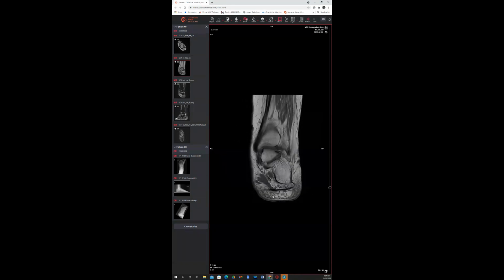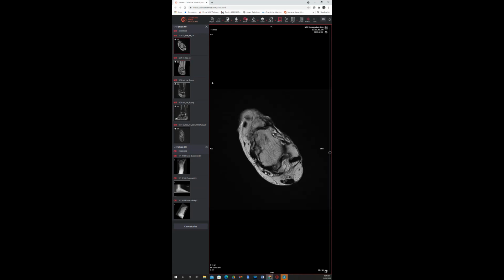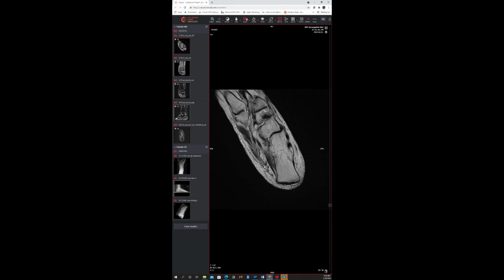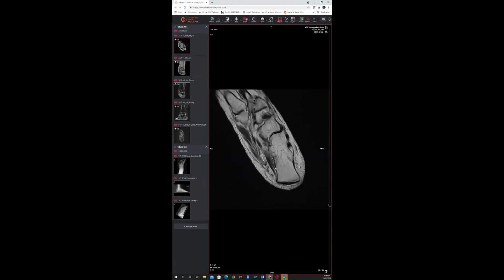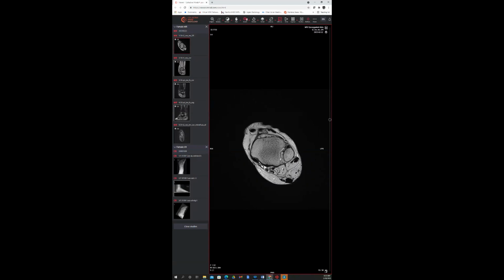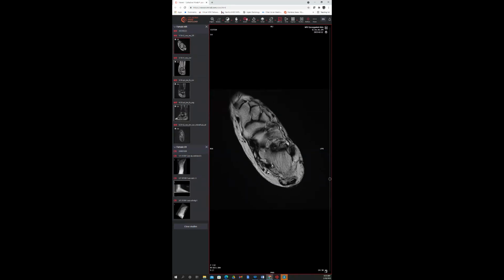Looking at the plantar fascia, thickened central cord, abductor digiti minimi atrophy. This is a very common finding, especially when you think about the biomechanical strain that is going on the posterior tibial nerve. As we make this valgus, this nerve has to stretch, the lateral plantar nerve, which gets to the abductor digiti minimi. So all in all, this is a mixed biomechanic of pes cavus with hindfoot valgus and the advanced degenerative changes that can ensue.